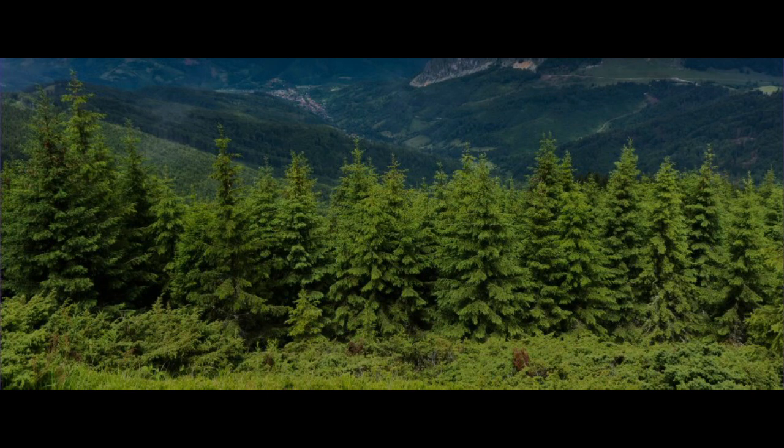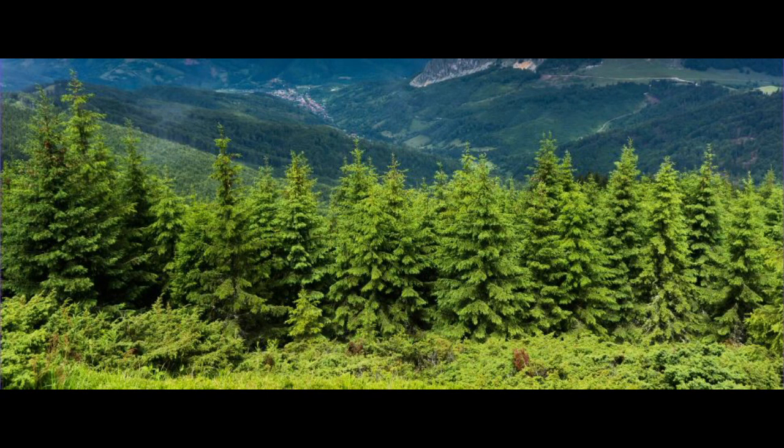An analogy to the layers, or superimposition, of different frequencies within a channel is an image of several treetops. The faster activity, say for example, beta waves, are analogous to the individual leaves, while the slower activity, say for example, delta waves, are analogous to the silhouette of the treetops across the image.